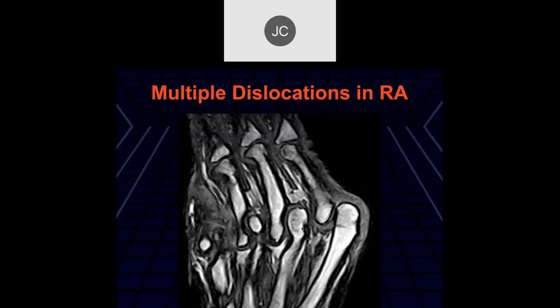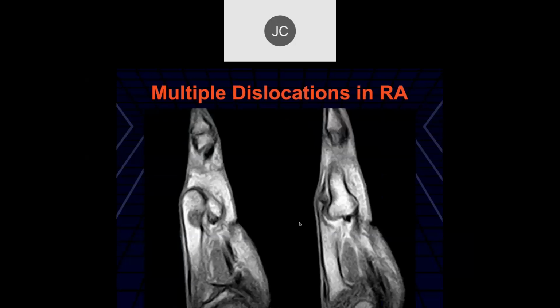I'm sure it can occur with other diseases, but it's been pretty pathognomonic of rheumatoid arthritis in my experience when we used to do a lot of imaging of RA patients. It also is ulnar drift, right? Yeah, good.